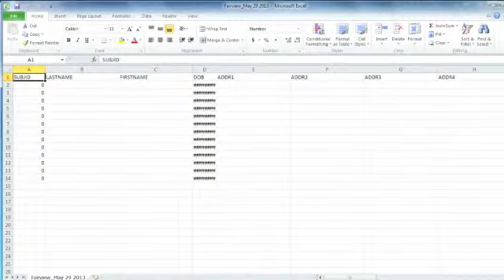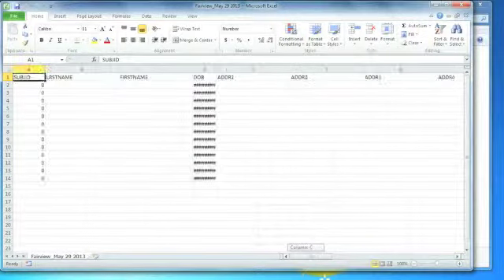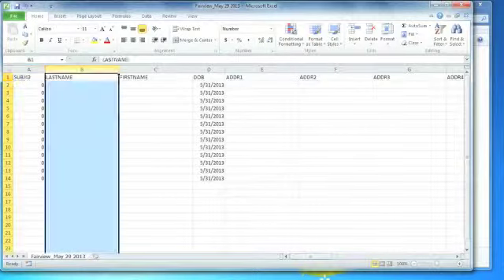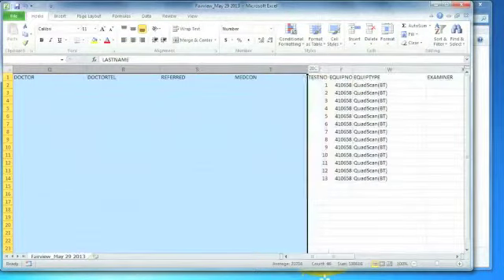The date of birth, actually, because we're not entering the birthday into the Quadscan device, I'm not asking you all to do that. What I want you to do is just highlight, so clicking up here on that space so I get the whole column highlighted, and I'm going to delete columns B through T, and I'll show you why in a minute. Okay, so make sure I do not delete the test number and onward. That's where all the real data begins, at column U.